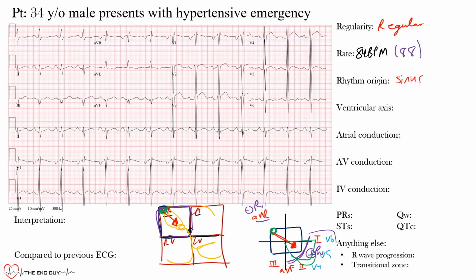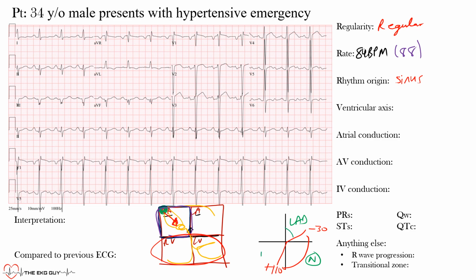Now there's a ventricular axis, and the ventricular axis, as you would expect, has to do with the ventricles, whether it's the depolarization axis of the QRS complex or the T wave axis. Okay, and we're going to focus on the depolarization wave of these ventricles. Now, normal ventricular axis is between -30 and about positive 110 or 105 degrees in that region there. We consider that normal. We consider this region here left axis deviation, this right axis deviation, and up here a northwest or superior rightward axis. Here's north, here's west, and that's where we get the northwest.